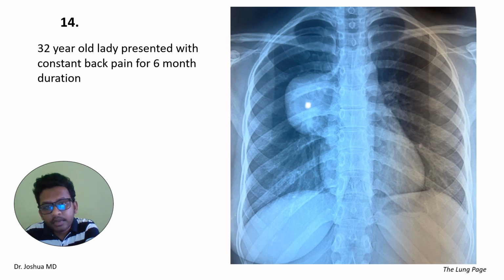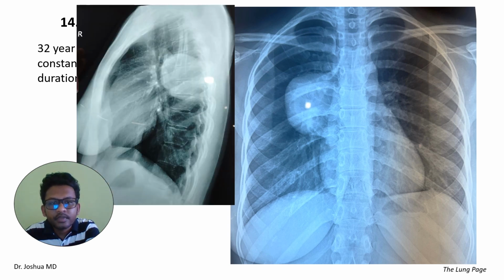It may be an anterior mediastinal tumor or posterior mediastinal tumor or sometimes other lymphadenopathy. In the lateral view you can see clearly here a lesion in the posterior mediastinum. We all know the causes of posterior mediastinal tumors: usually neurogenic origin, neuroma, schwannoma, sarcoma, those things. So here this is the hilum overlay sign with a posterior mediastinal mass.